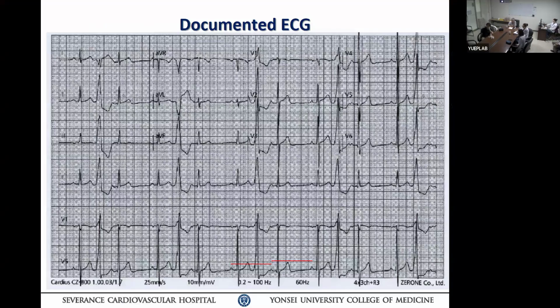That's another problem. So when we are reading these ECGs, you really try to get out as much information as possible from the ECG for your procedure. I'm sure you guys have the ECG looking at this because you're thinking about ablating this these days. Because unfortunately, we ablate first, look at it later. That's a mistake. You can make the procedure longer. So get the data out as much as you can. And if you have a question, ask. Okay, and we can discuss it, and you can plan how to do this procedure better.